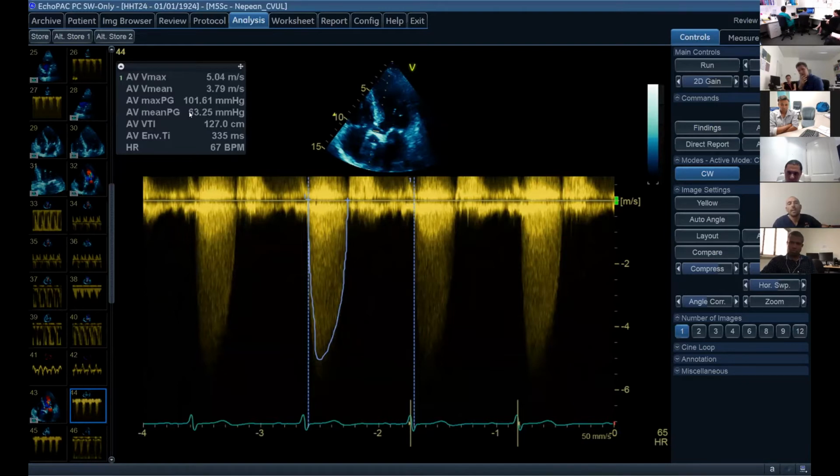Yeah, I agree with all of that. Why are they inaccurate though? This is where the crunch comes. This is the bit that I don't know whether it would be pass or fail on this question. It would be for the gold mark bit. So I agree we're probably dealing with severe aortic stenosis, but why am I harping on about these gradients? Why are these gradients potentially inaccurate?